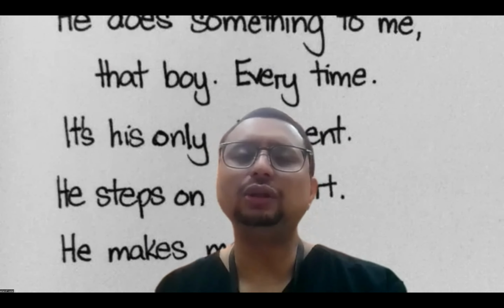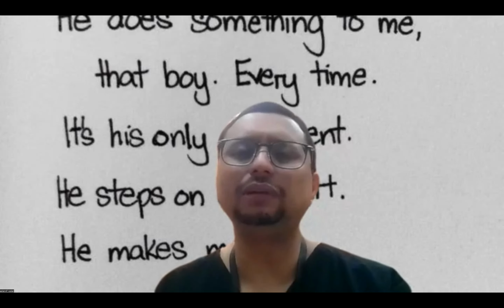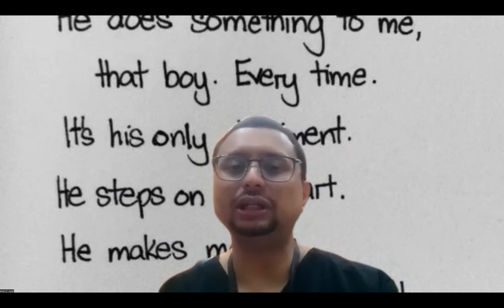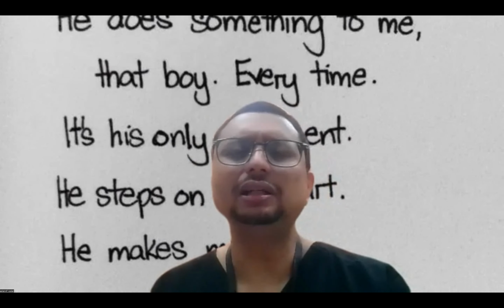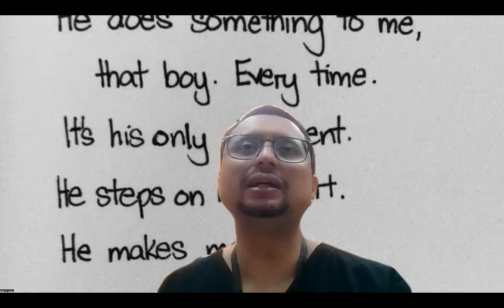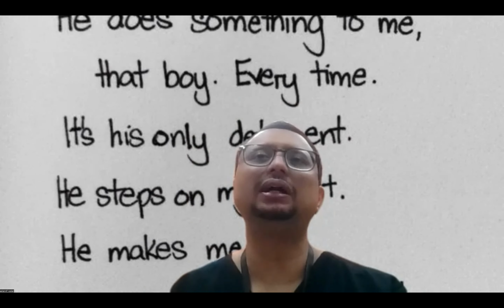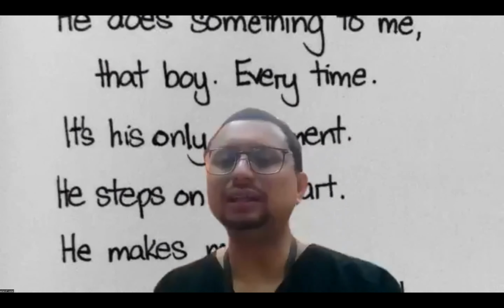But by just looking into ejection fraction, it might not be sufficient, because when the ejection fraction comes down, it might be too late to intervene already. So nowadays, we use speckle tracking. Rather than waiting for the ejection fraction to come down, we look whether the speckle tracking value comes down before the ejection fraction, so we can actually intervene earlier.